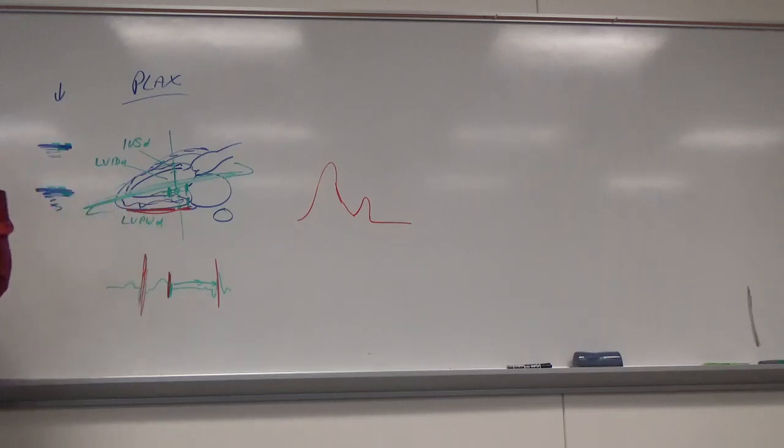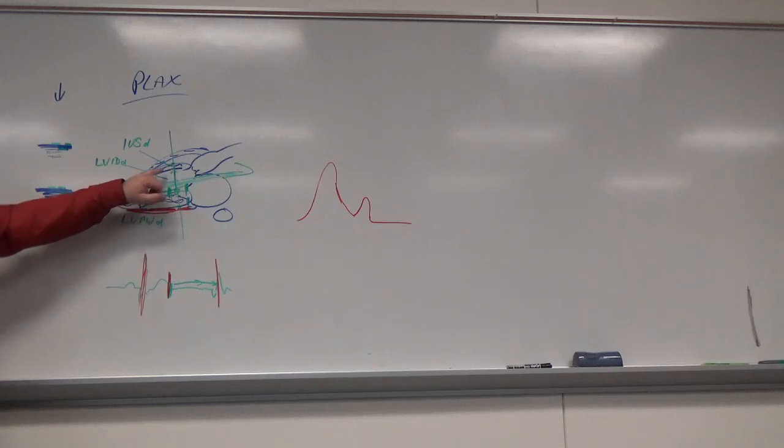So the normal is basically 7 to 10 millimeters. They are slightly different for women and men. There are all kinds of charts, and they divvy them out by gender, but they also divvy them out by race. So there's tons and tons of charts, but we'll try to keep it fairly broad.